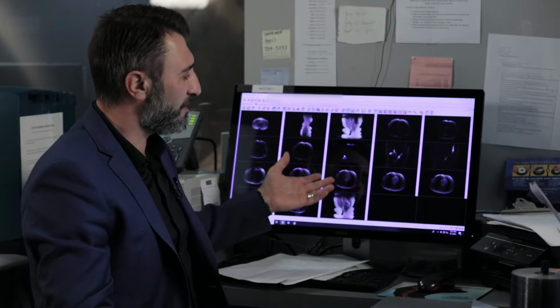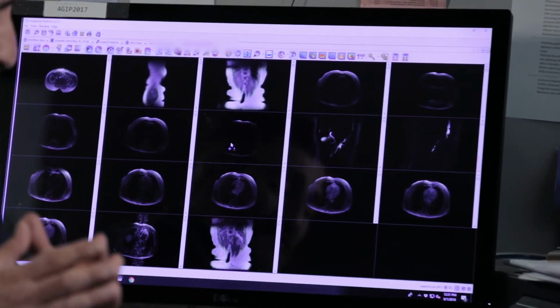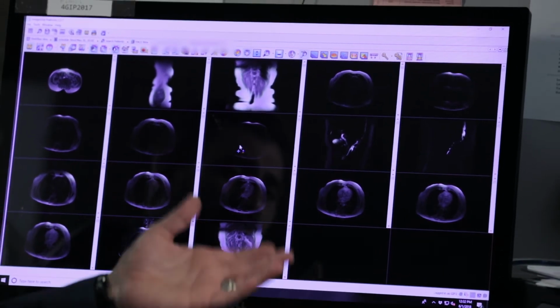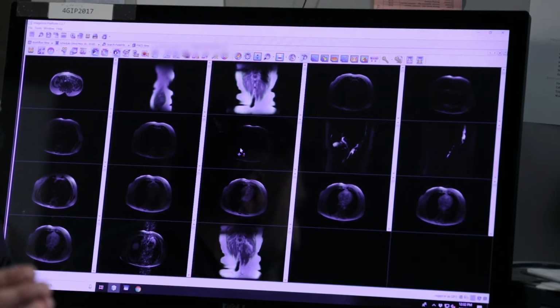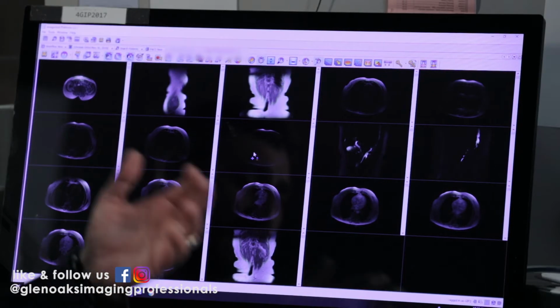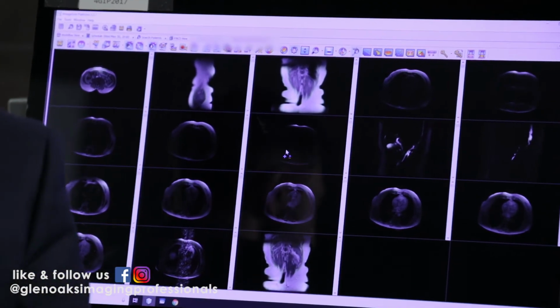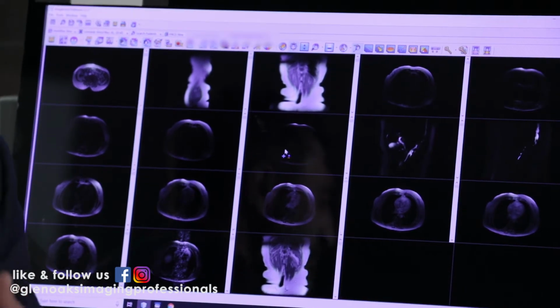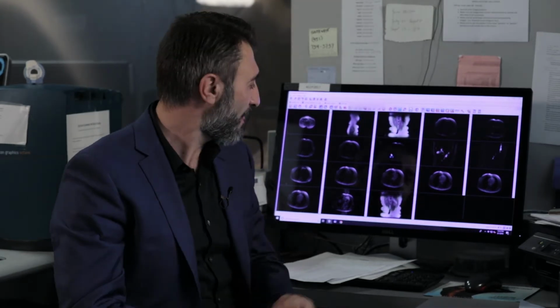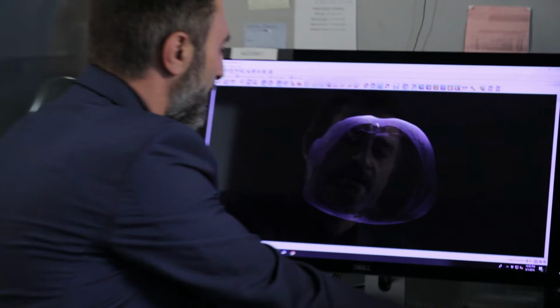The good thing with the MRI is we can specifically do a sequence to look at the fat. We can specifically look at the soft tissue, and also we're able to spin the patient into whichever direction we want to take the picture, and that's the advantage of the MRI. MRI of the abdomen is rarely done for screening purposes, so usually something is going on when you go into an MR and you try to pinpoint exactly what that is. I'm just going to show you some images so you see what the MRI looks like.